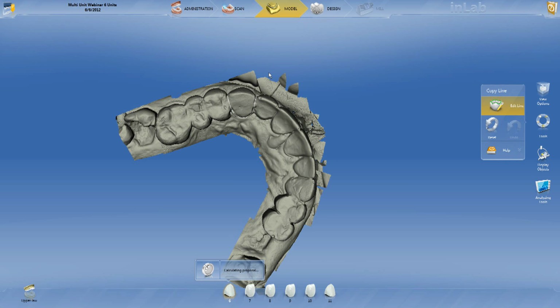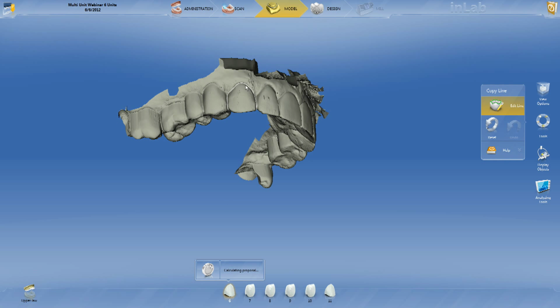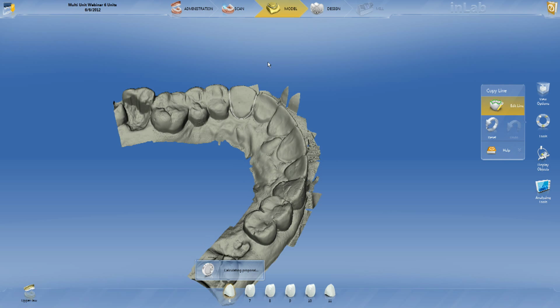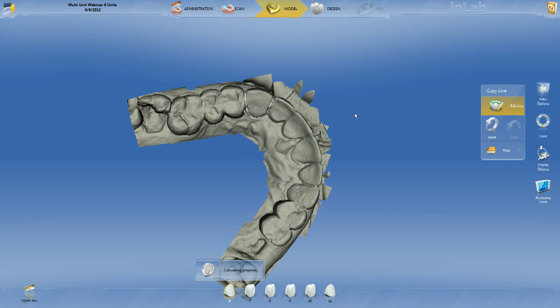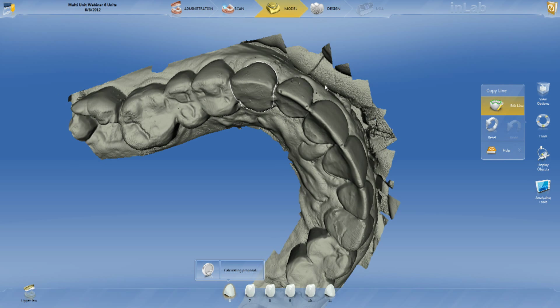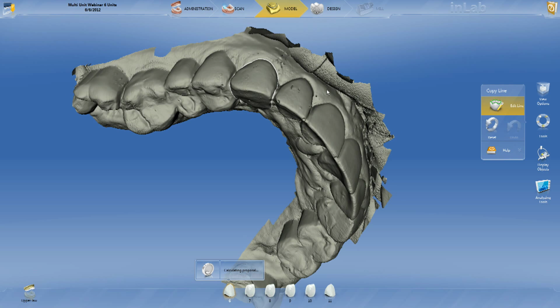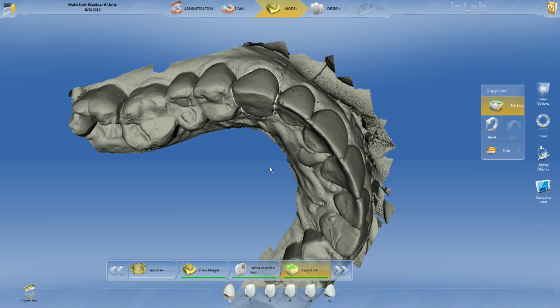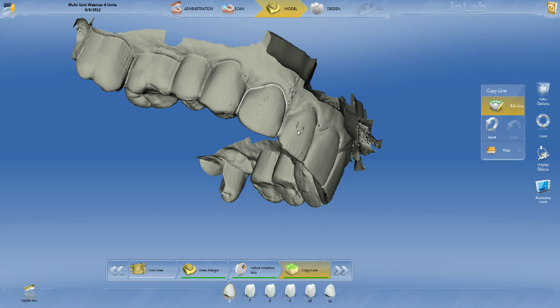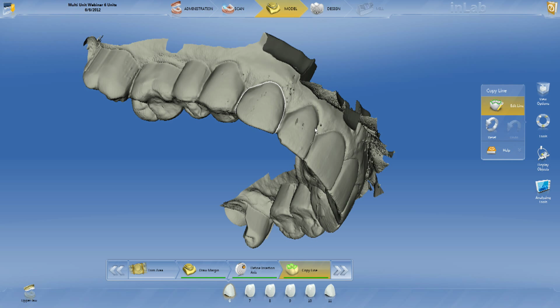It's kind of like 3.8, so we have to make sure that the areas that we want to copy are marked. So as soon as it calculates, we can alter it if we'd like to. You can go back and just change it up. And let's move forward.